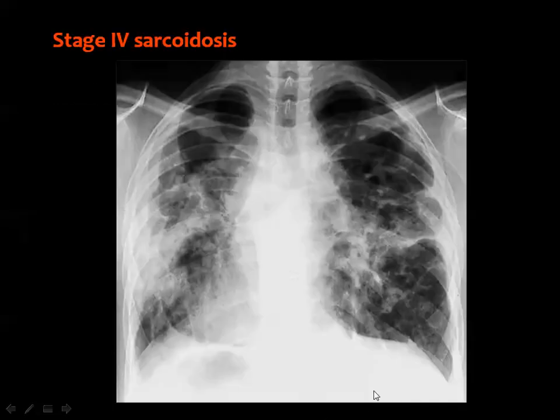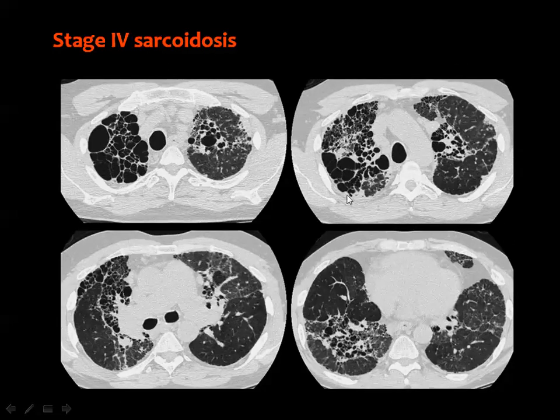history of smoking. Sarcoidosis can also affect the lung, and it follows many stages in affecting the lung parenchyma and the lymph nodes. At the end stage, or stage 4 sarcoidosis, there is complete destruction of the lung, producing a pattern similar to usual interstitial pneumonia in the form of multiple honeycombing, interstitial opacities, areas of air trapping, and ground glass veiling.